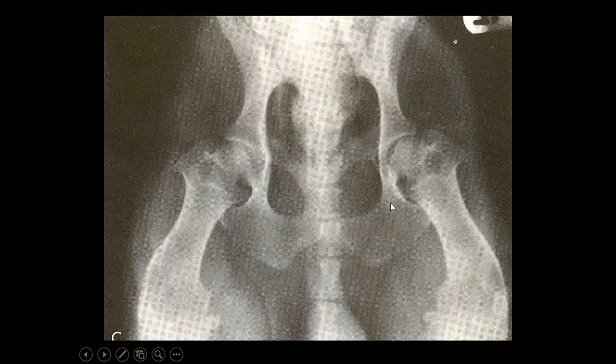Now, what about this dog? Well, these are basset hounds and bulldogs. These dogs have abnormal limbs in the first place, the chondrodystrophic breeds. This is probably a normal hip for this dog. Look at how short the femurs are, how square they look, but not bad contact there, and the femoral head is pretty good.